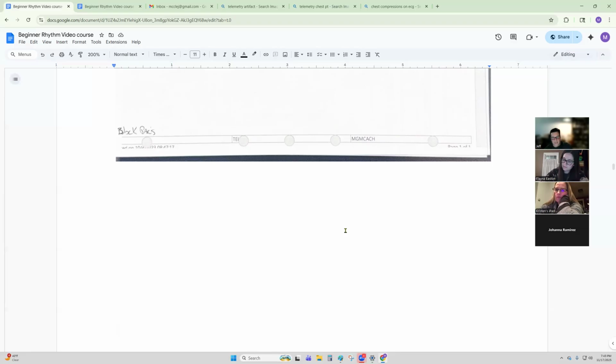is an SVT, and AFib is generically an SVT, because when they convert to SVT, they tend to be very fast, and it's still going to be a narrow QRS because it still comes from the atrial chamber, goes down through the AV node, through the bundle of His and the septum, and goes out through the Purkinje fibers. Even though it is, broadly speaking, an SVT, we have a better label because we're going to look at it and say, all right, there's no P wave anymore.